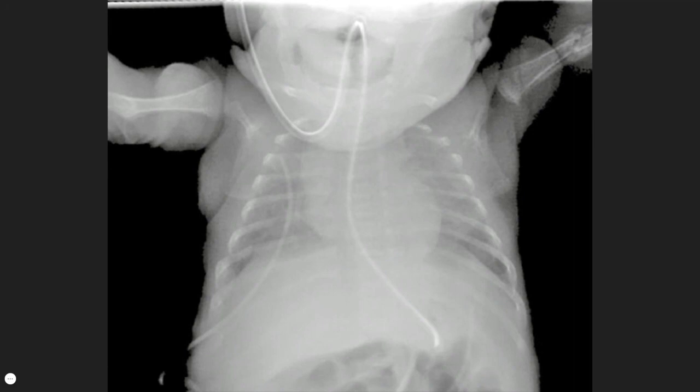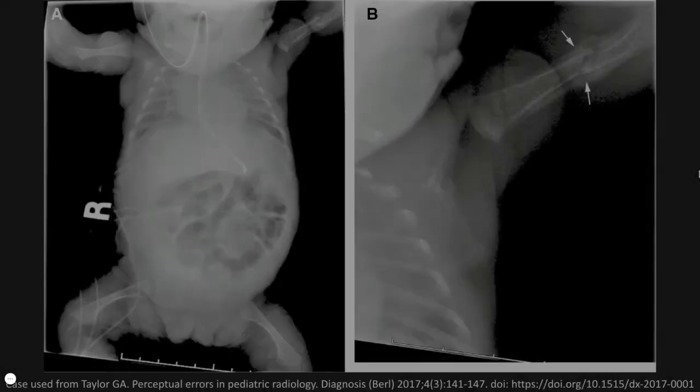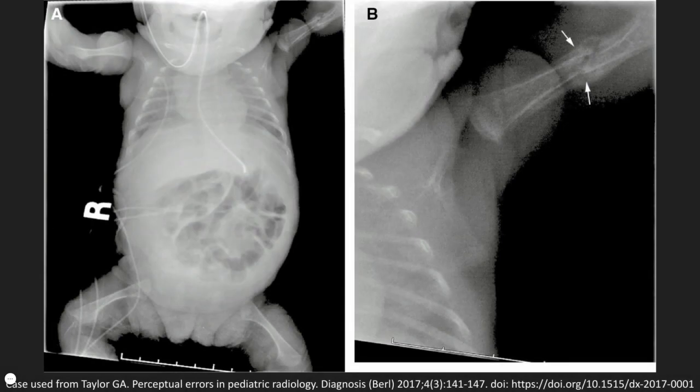In an exam situation, you would want to succinctly summarize the case. So you would say something along the lines of, this is a frontal chest radiograph of a paediatric patient performed for nasogastric tube position. The nasogastric tube is satisfactorily sited, but there is an incidental healing fracture of the left humerus, which is suspicious for non-accidental injury. I would discuss my concerns with a senior colleague in the first instance. Here is the reference for that case, which was initially performed as a chest and abdomen, and a zoomed up view of the left humeral fracture.